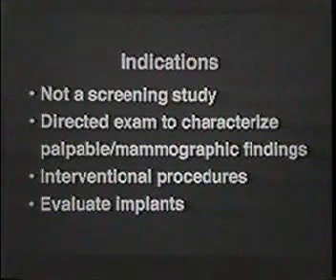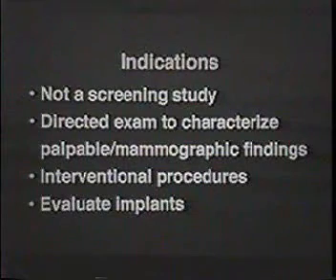What it is in the breast is a directed examination to characterize a lesion that is either palpable or found on mammography. It is also an excellent method to guide interventional procedures, largely because it's done with real time.